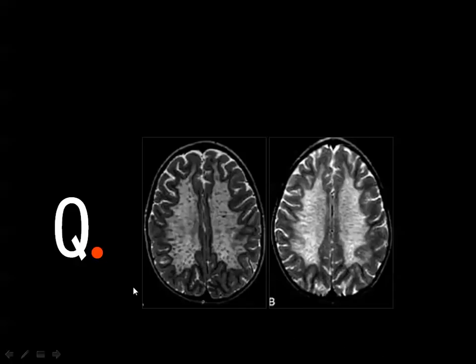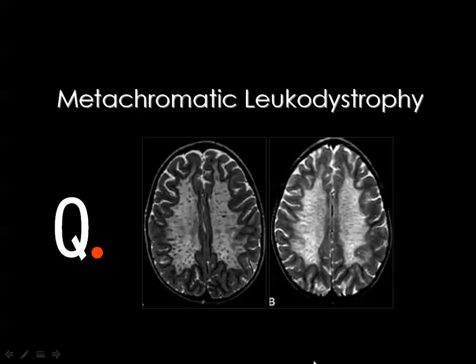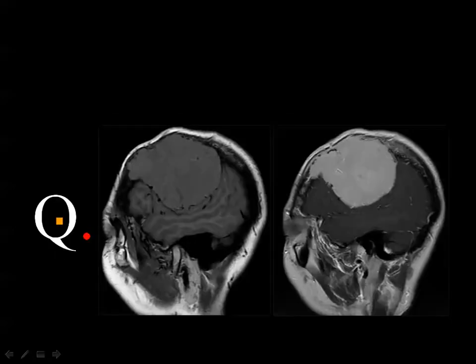Leukodystrophy, axial T2 weighted MR images showing diffuse white matter signal abnormality with intermediate linear and spotty lesions or areas within the white matter, giving the characteristic tigroid pattern, which is diagnostic of metachromatic leukodystrophy and Pelizaeus-Merzbacher, but metachromatic is relatively more common.